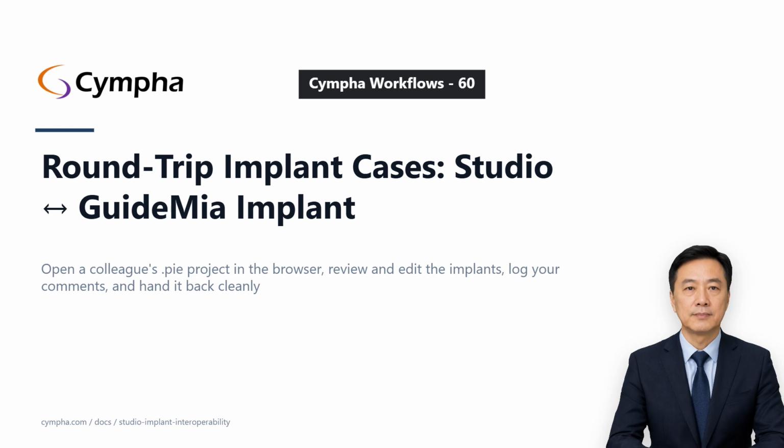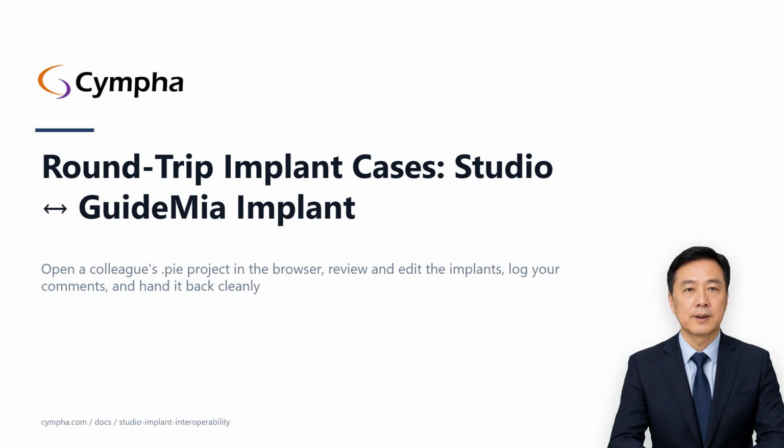Welcome to Guide Mia. Today we're going to talk about round-tripping an implant case between Cympha Studio and Guide Mia implant software. This one is for clinicians and implant designers collaborating across the browser and the desktop. Either side may have created the case, and either side can review, adjust, comment, and hand it back.